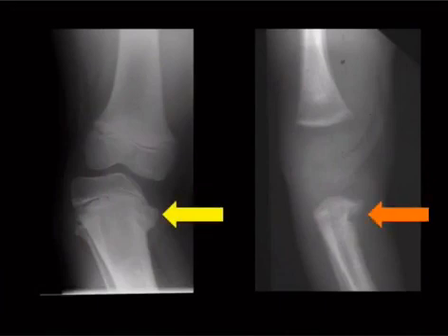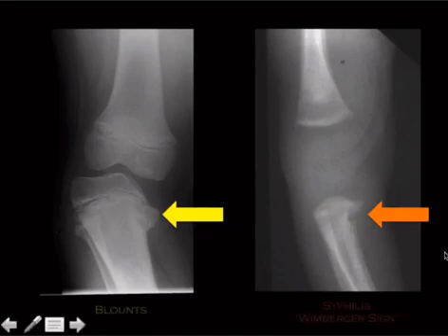All right, so this is another thing here that sometimes people mess up. So we've got a lesion here, and we've got another lesion here. Obviously, they look a little different. This one looks like somebody took a bite out of it. This is a so-called Wimberger sign of syphilis, as opposed to Blount's, which we just looked at.